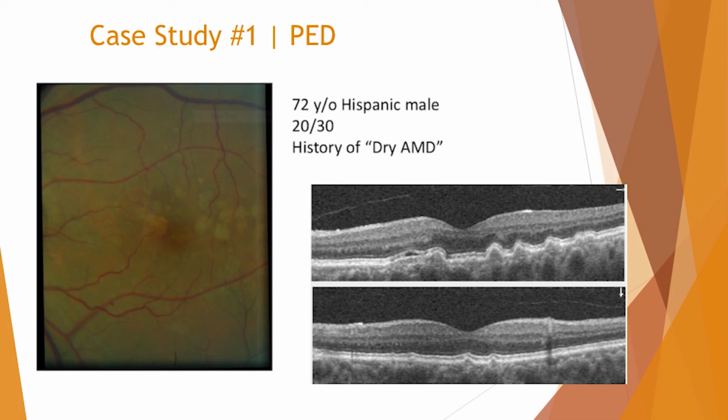See the pinkish orange spot there next to the fovea? I said, let's get some B scans. We do the B scans, he's got lots of drusenoid PEDs, okay? But the concern was on the scan, there's a little serous pocket of fluid there above one of the drusenoid PEDs. Whenever you see serous fluid associated with PED, you worry that there might be CNV, right?